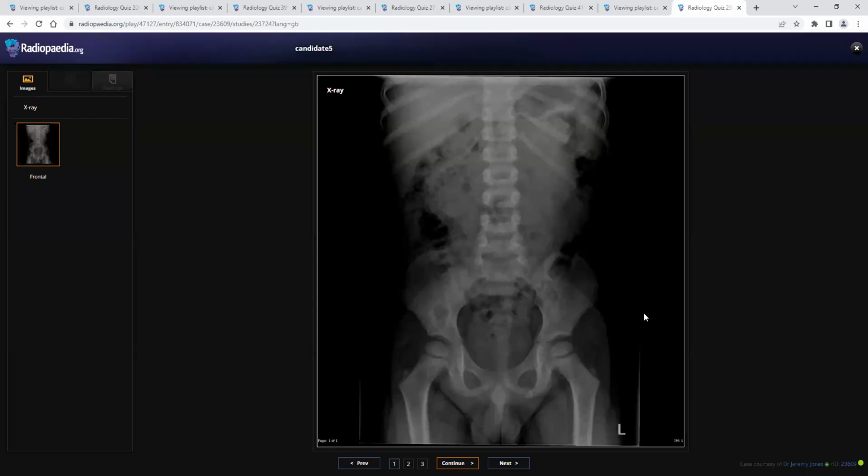Apart from some fullness of the fat planes, I don't see any other abnormality, although I was suspecting that the epiphysis of the left femur was a bit smaller as compared to the right side. Okay, but the patient is telling right hip pain. So the fat planes are distended on the right side. The epiphysis appears unremarkable.